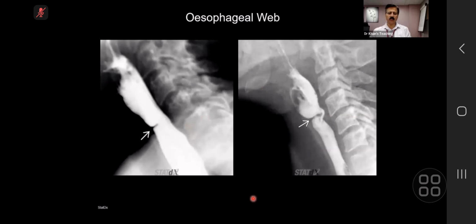So this is an aunt mini case. Either you know it or you don't know it. You can see anteriorly there is a shelf-like filling defect. Remember these words: shelf-like filling defect. This is slightly more advanced or a more prominent example of the same.